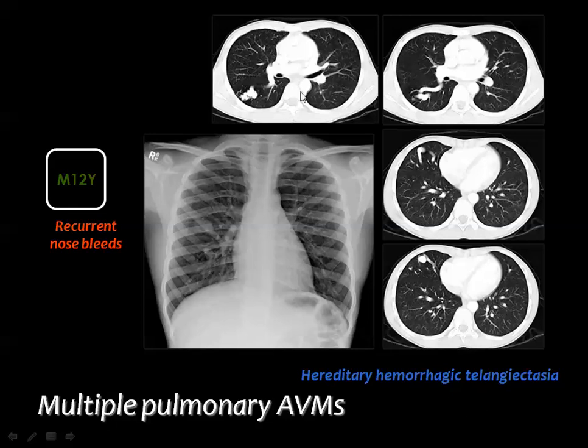If you look here in the chest X-ray first, then you can see a nodule in the right lung, and this nodule is connected to the hilum by what looks like a dilated vessel. And the CT scan showed the nodule in the right lung and is connected by a prominent vessel to the hilum. And it's very important to know that you may be able to see only one of the two cords going to the nodule, and this is enough for the diagnosis.